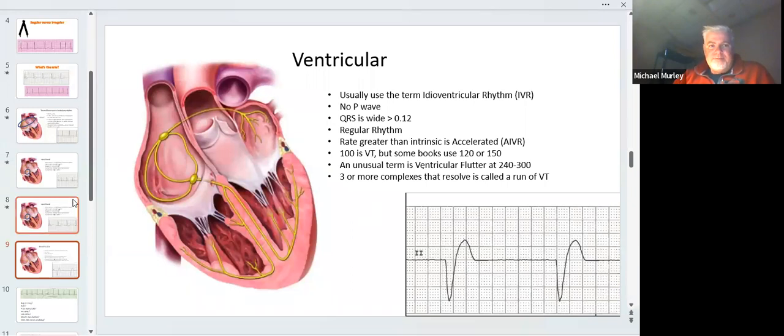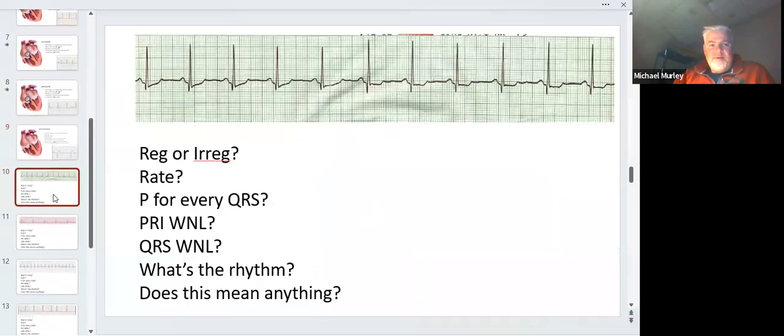So yeah. Let's see what's next. We'll just do a couple of these real quick. And I know I went fast on these, but go back and watch it again, or maybe it didn't make sense. Is this one regular or irregular? I'm just going to use my fingers on the screen. This is a regular rhythm.